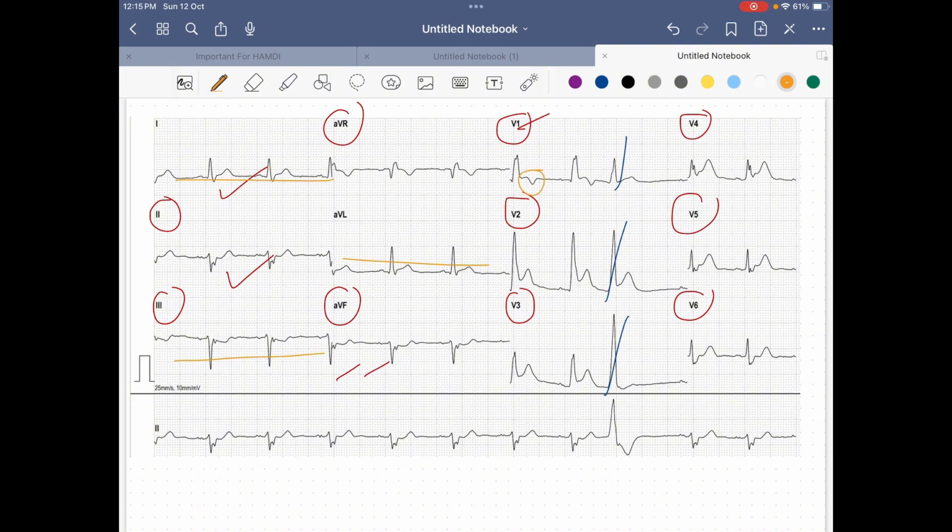Observe those T-wave inversions, okay? And when you also note that you've got depressions in all the lateral leads, reciprocal changes, and in all the inferior leads, reciprocal changes, okay? In this case, you have to think that the occlusion is in the proximal LAD.